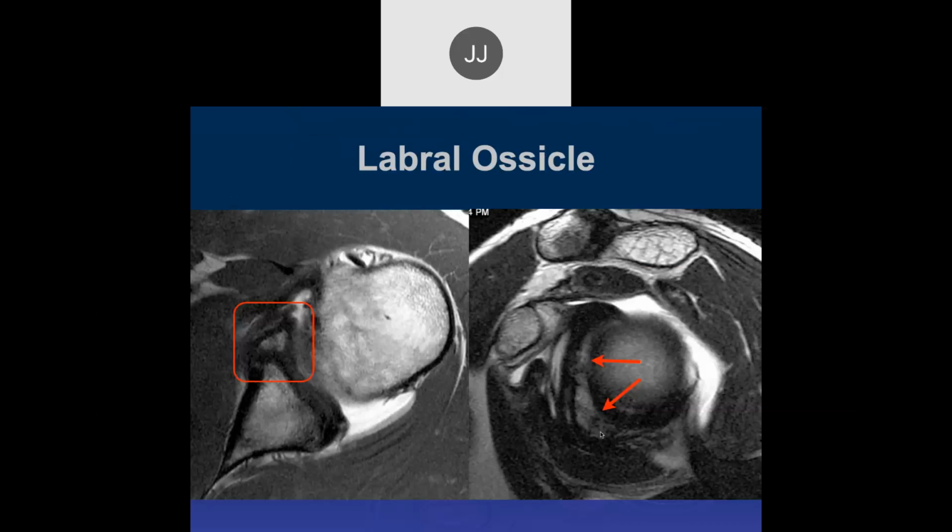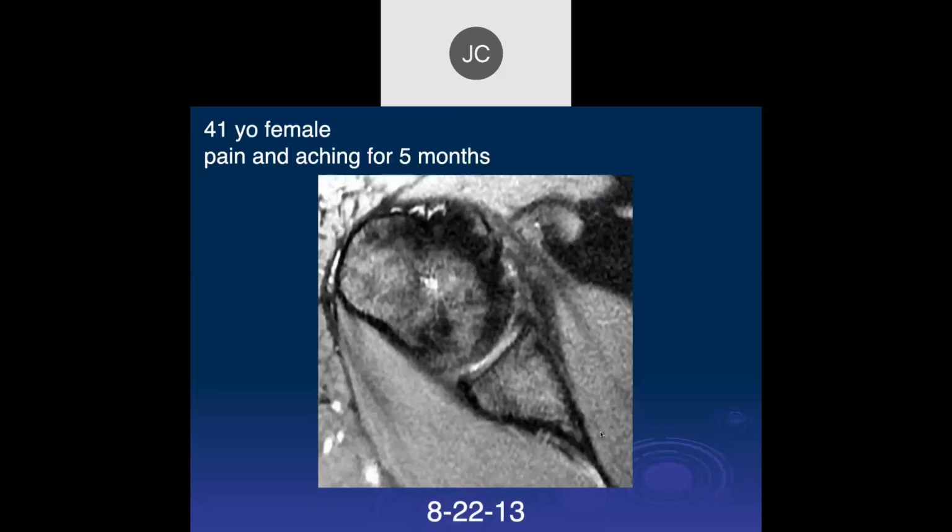I think these occur from trauma, and then over time these areas of trauma can heal with ossification, just like we've seen in other areas. These are really pretty rare, especially ones of this size. But just remember, you can get ossicles within the labrum, which is probably post-traumatic.